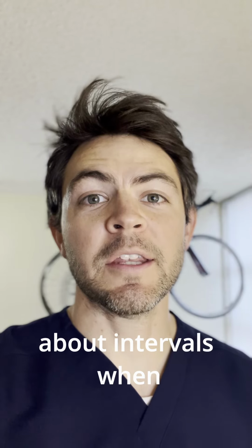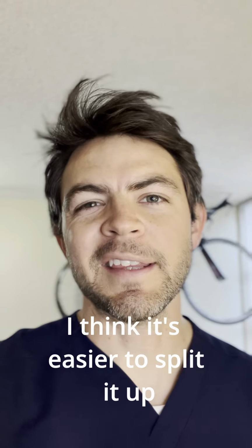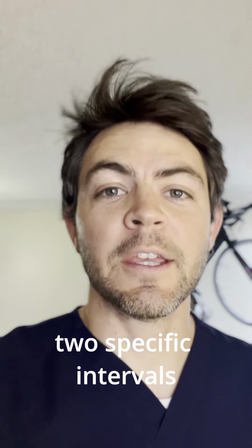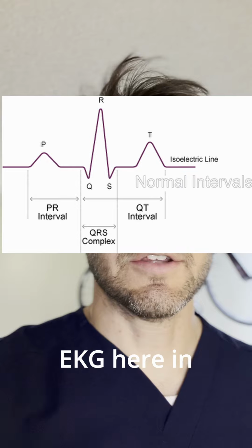Today we're going to be talking about intervals when you read EKGs. This is actually going to be a two-part video because there's quite a lot to cover and I think it's easier just to split it up. In this video we're going to be talking about two specific intervals that are easy to see on the EKG, and that is the QT and the PR interval. You can see both of those on a normal EKG here in this image.